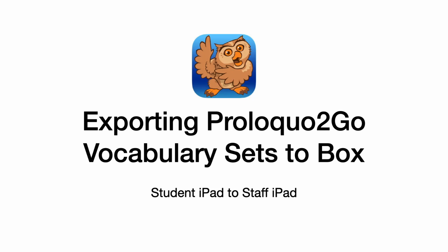Hi, in this video, I'm going to show you how to export a Proloquo2Go vocabulary set from a student iPad up into Box on a staff iPad. The reason we're using Box is because that's where you can save a backup of those vocabulary sets. We never want to lose those, right? We never know what's going to happen to an iPad, whether something happens to it or we get a new iPad, we're going to want to make sure we have a copy of those vocabulary sets.